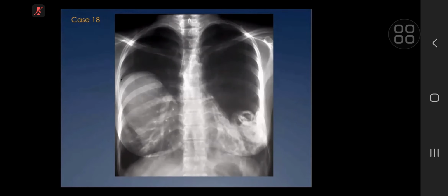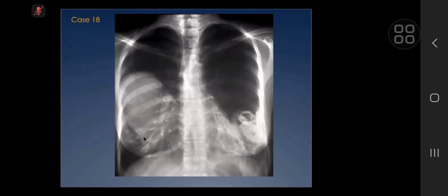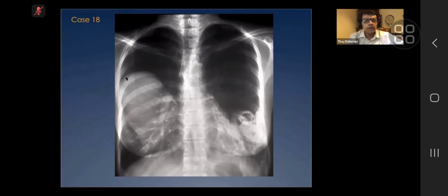Okay. So is that not correct? Is that not right? Yeah. Yeah, I was thinking of this in the context of infection, so I was just going down that line. But you're right. Yeah, well-defined, smooth-bordered, large, soft tissue density mass lesion in the right lung, and there is a left lung cavitating lesion.